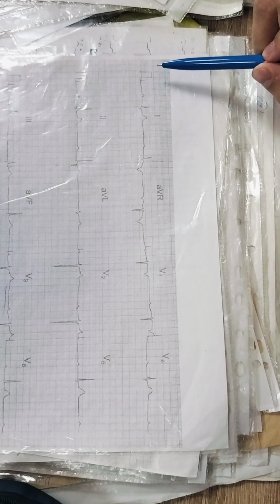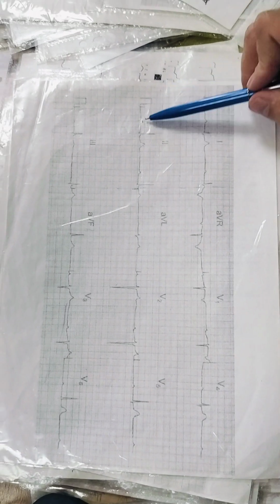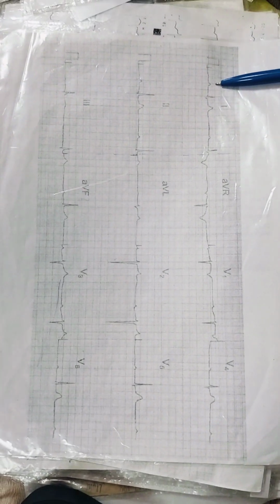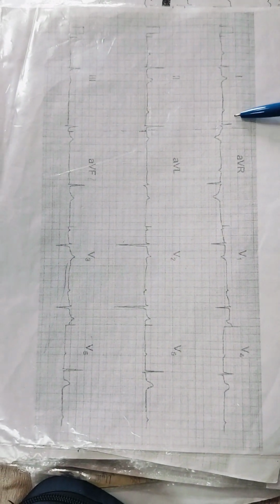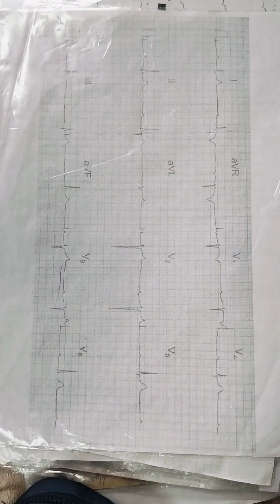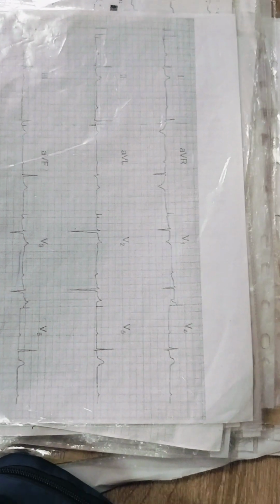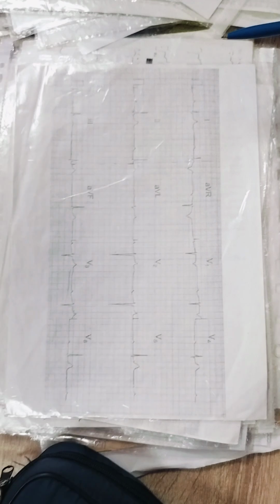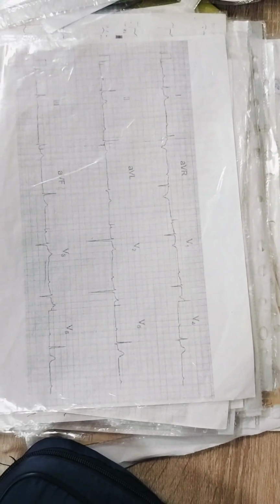So this card is not about myocardial infarction. Quality is okay. P waves are here. Electrical axis in the middle. Rhythm is regular or not, it's not clear because there are only two complexes. So how can we conclude this is regular? It's part of a real card. In a real card we need to register at least 3-4 complexes.